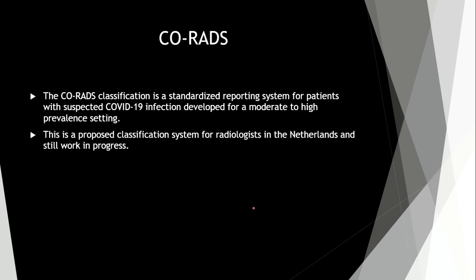CO-RADS classification. Why do I place it here? This is not the abdominal cavity, but I want you to learn your whole life. If you want to be a good doctor, you must be up to date all the time.